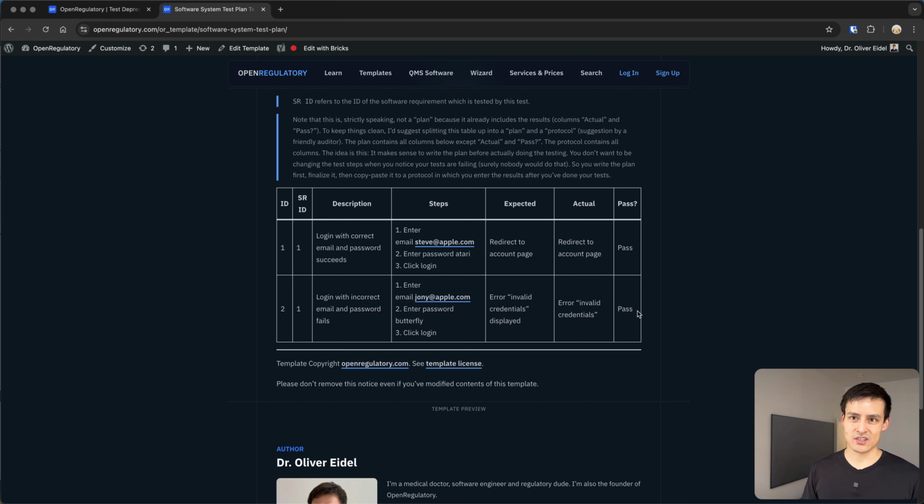And that's how a simple implementation would look if you would, for example, copy-paste this to Google Sheets, which I actually did in our old videos before we had Formwork. And you can already see where the problems are when linking stuff, because it might work for your first implementation, but what happens if you change an ID or you change the content of a software requirement in the other table, and of course this table doesn't really get updated and you're completely screwed. So you don't really know whether your documentation is complete at any point in time.